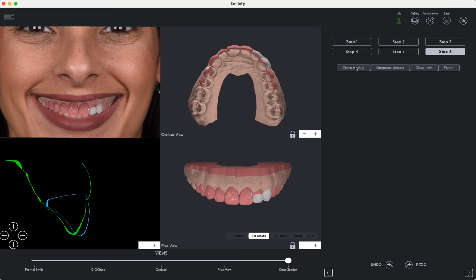So do we want to correct the position of the teeth with ortho? Yes. Then we can design way better, and the design is not going to be limited by the initial position of the teeth. We export and we can print, we can create a mock-up and create for the patient not only the beautiful experience of a new temporary smile, to see how everything looks when everything is aligned, when everything is white and shiny and with new forms, but also to have a clinical analysis of the treatment plan in the next steps of the treatment.